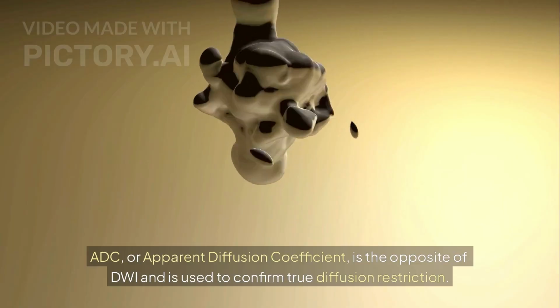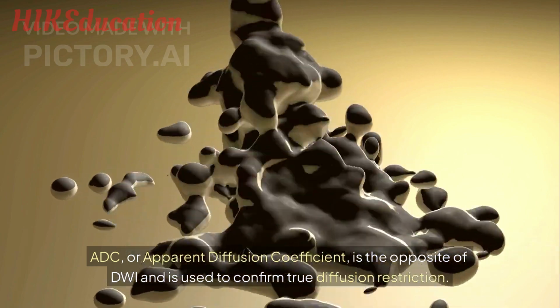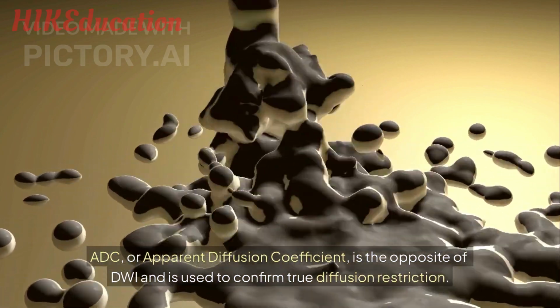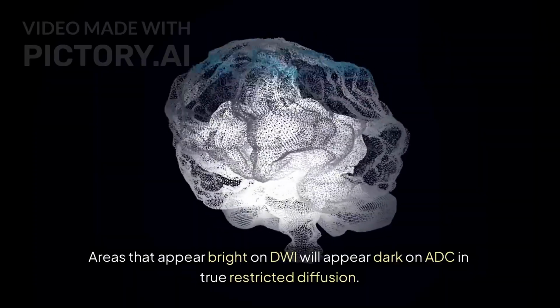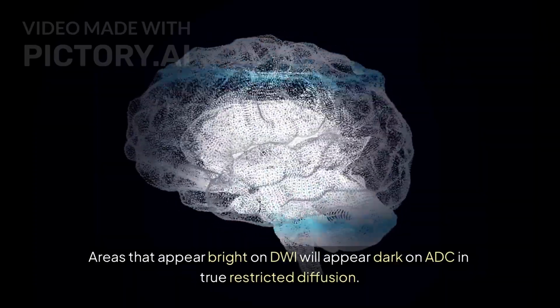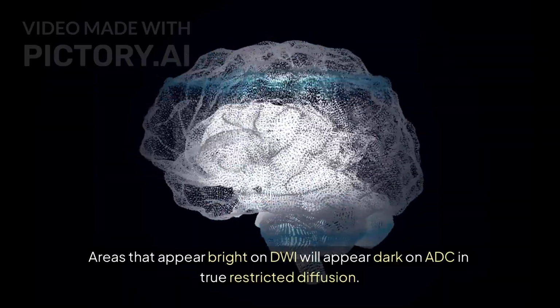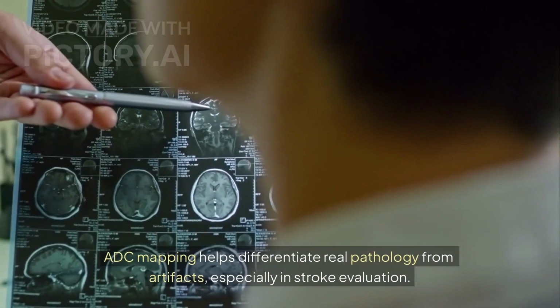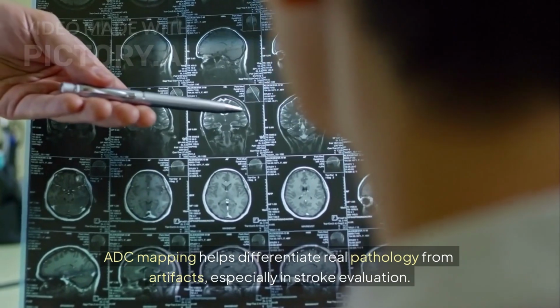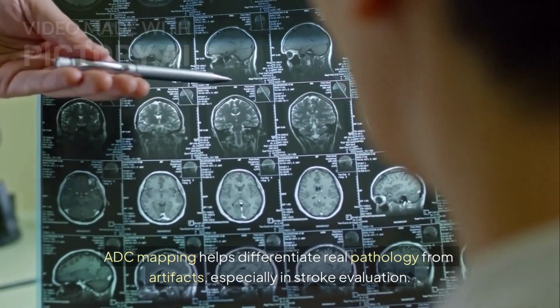ADC, or apparent diffusion coefficient, is the opposite of DWI and is used to confirm true diffusion restriction. Areas that appear bright on DWI will appear dark on ADC in true restricted diffusion. ADC mapping helps differentiate real pathology from artifacts, especially in stroke evaluation.